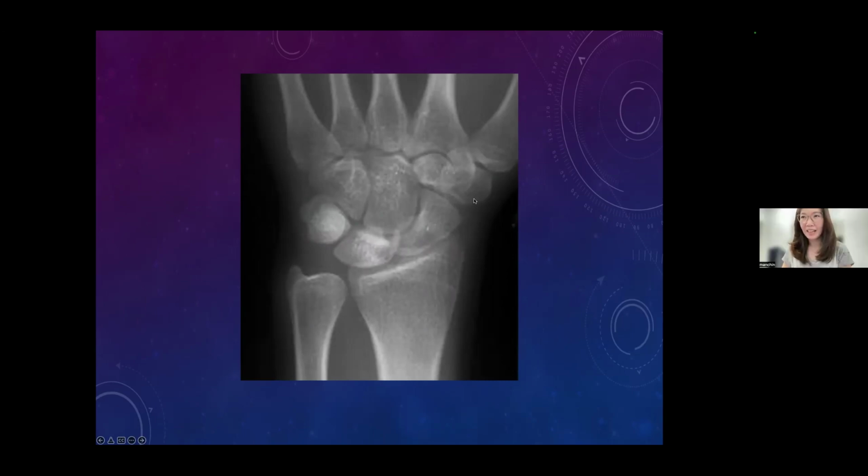Okay. And then after that, what about this? We have 8 carpal bones. Elena, what is this? Or other people? Okay. Anyone? So this is a trapezium, trapezoid.